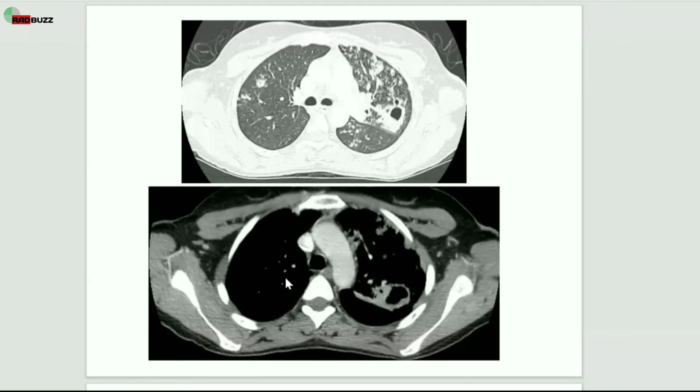It can be bilateral. Here we can't see, this is soft tissue window, that's lung window. You can see enhancing walls of this cavitary change in the upper lobe with scattered areas of airspace opacifications. They're more in the upper lobe. They're bounded by fissure. The superior segment of the lower lobe can also be involved. Otherwise, upper lobes are more involved.